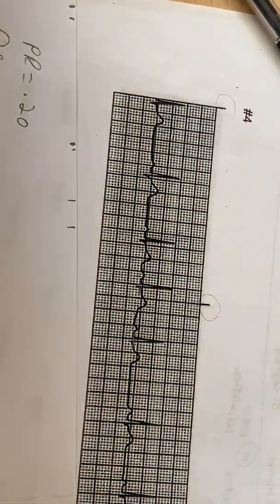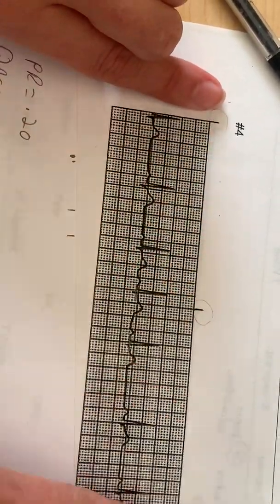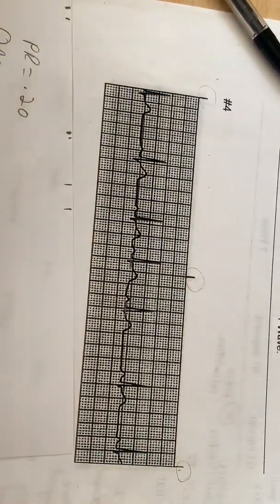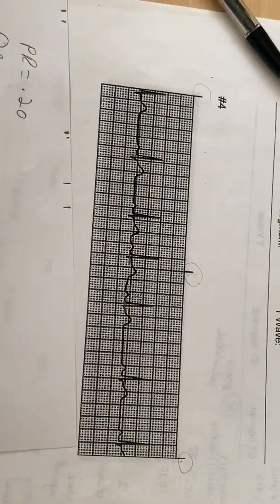And then the rates, you don't need calipers for rates. It is the 6 seconds, right? You need 1, 2, 3 hash marks, and whatever falls in those hash marks. And you don't need calipers to determine P waves and T waves because you're just kind of eyeballing those things. And I think that concludes our measurement video.